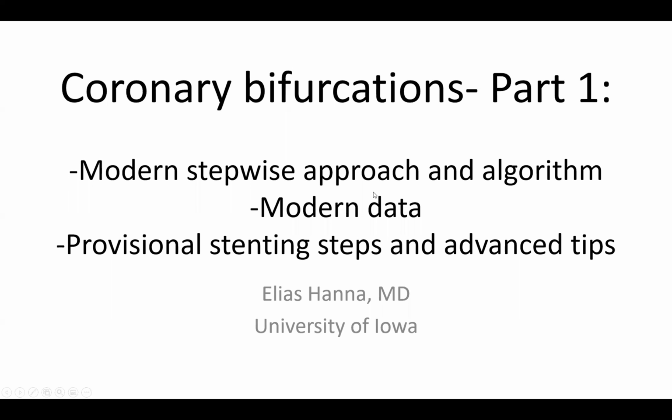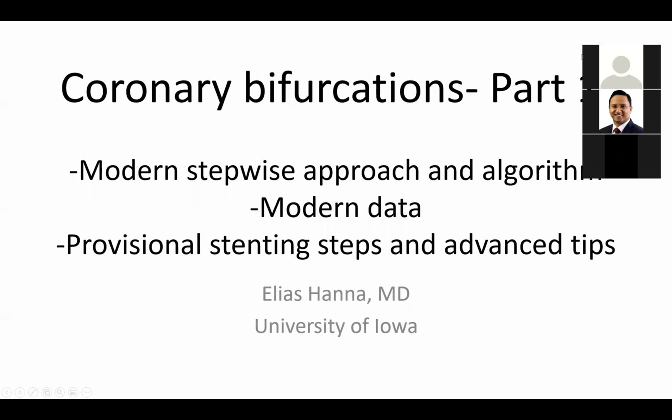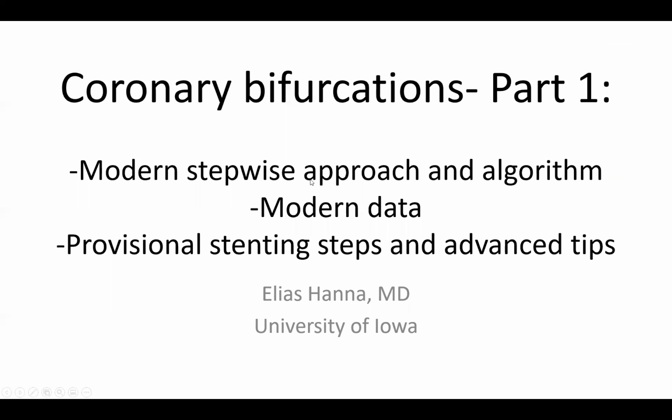I will talk today about coronary bifurcations. I will provide a modern stepwise approach based on modern data. And I will provide mainly the details of provisional stenting steps and advanced tips of wiring, ballooning, and stenting in a provisional fashion. In a second part, I will detail the technical details of a planned two-stent strategy.